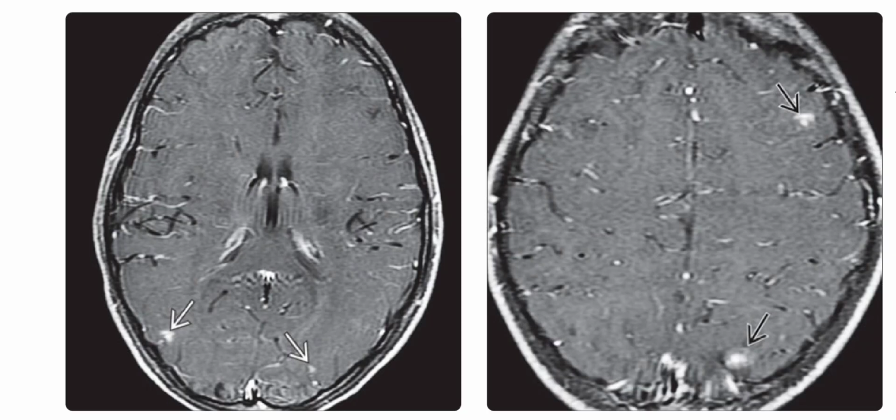So some more cases of hereditary hemorrhagic telangiectasia. Left is the axial T1 contrast-enhanced fat-suppressed MRI scan, but it was done on 3 Tesla. It was screening MRI, and it was obtained in this 11-year-old female with a family history of hereditary hemorrhagic telangiectasia. And it shows 2 tiny fluffy foci of enhancement, which are very much consistent with capillary vascular malformations, which are also sometimes called micro-AVMs.